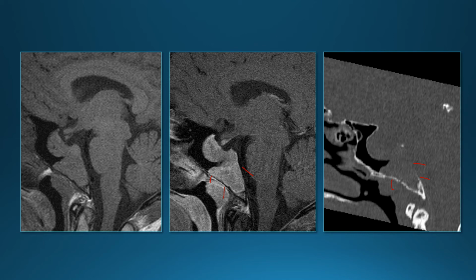One helpful thing, very key point with the pituitary adenoma: since it starts in the sella, you'll almost always see expansion of the sella here. So if you see expansion of the sella, you're almost always dealing with a pituitary adenoma. And regardless of whether they destroy the bone or anything else, they're almost all benign. There are hardly any pituitary carcinomas.